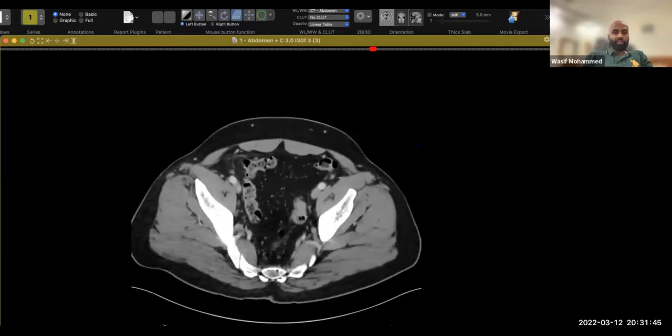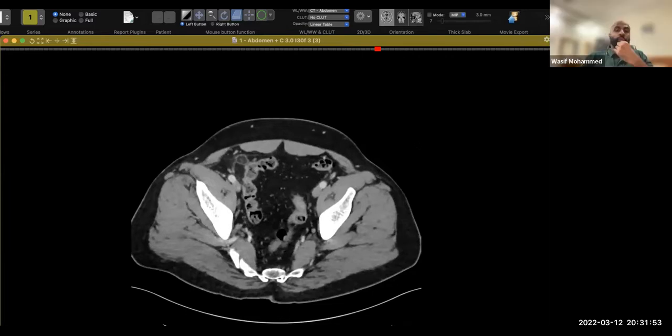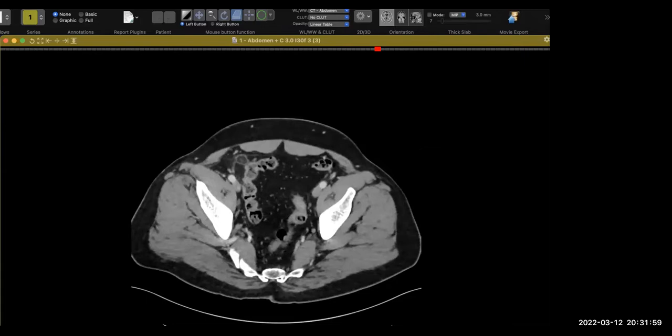Do you have a differential for this? Another differential could be an omental infarct, but the central dot. How would an omental infarct normally present? Radiologically, it will be much more ill-defined usually, and I think the site of an omental infarct is more along the left side, if I'm remembering correctly.